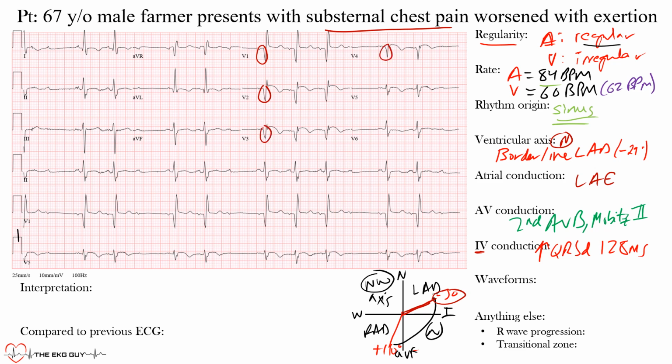In addition, you may notice that there is ST elevation. So here's our baseline. You can see some ST elevation also in these leads, maybe even slightly there, and flattening of them. Those are ischemic signs. And because you have Q waves associated with ST elevation, this is most likely an acute infarct. So that's one thing to keep in mind. It's involving leads V1, V2, V3, and V4, which are the anteroseptal leads. Notice in V5 you start to still see that R wave.